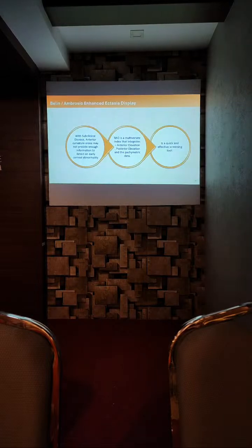So that's all about the first page. So next is BAD data. That is, we have to actually reverse the page. So why is there a need for this?